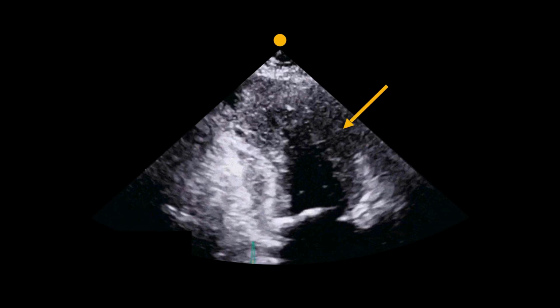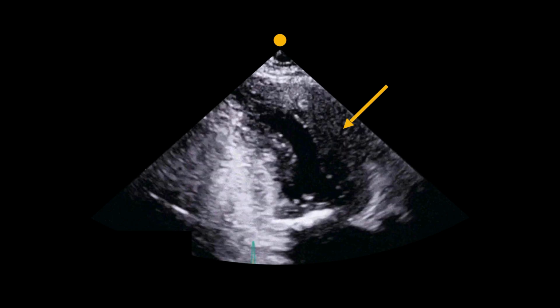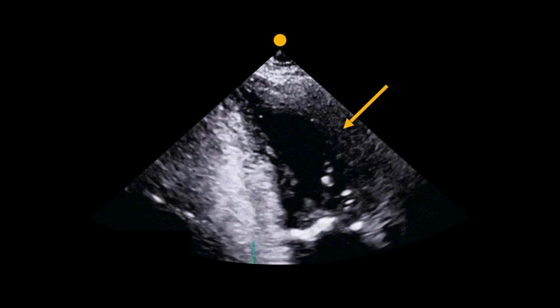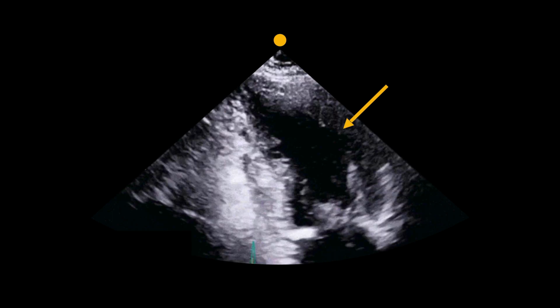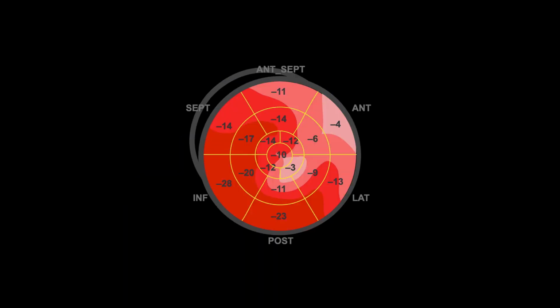In the case of increased left ventricle wall thickness and/or mass from hypertrophy or cardiomyopathy, systolic function is usually normal because the left ventricle cavity volumes are reduced. But analyzing the pattern of strain can help identify regional segments that may be reduced due to hypertrophy.